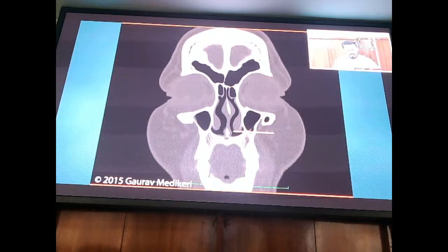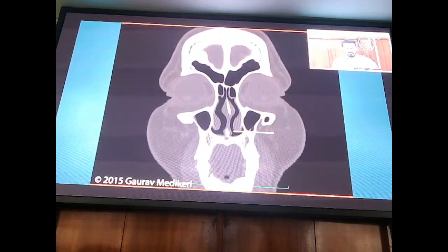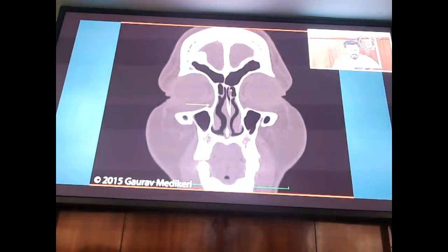The other thing that I want you to start paying attention to is, I told you there is a grooving happening in this bone, which is basically the housing for the lacrimal sac. Pay attention to the level of the maxillary sinus floor. It is above the level of the nasal floor here anteriorly. Okay. And now you start to see that it is opening into the agger nasi here. There is breaking of this frontal T, and you can see the frontonasal drainage pathway has started to appear.